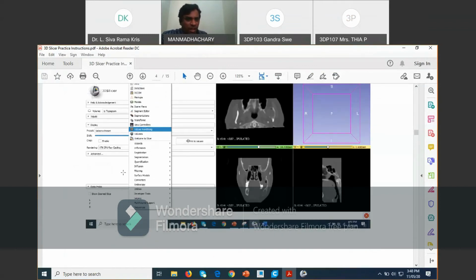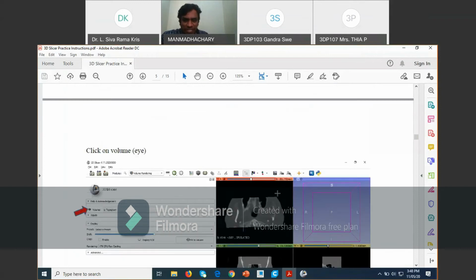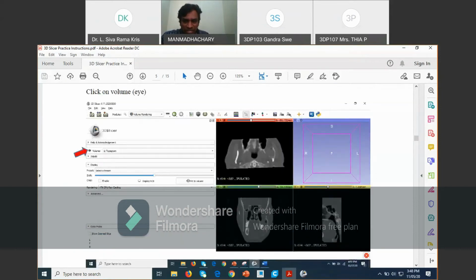Are you inputting images like this? Okay, whatever the images are showing. Yeah, images are there. I'm just posting it. Then go for the volume. Madam, sir, I'm clicking the volume. But you can see in the image in the WhatsApp group that it is not working. I'm clicking it, but it is not working, sir. All that is blurred, light color. I've just posted the figure right now.